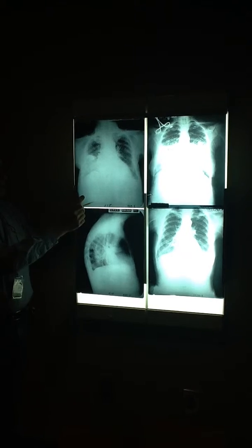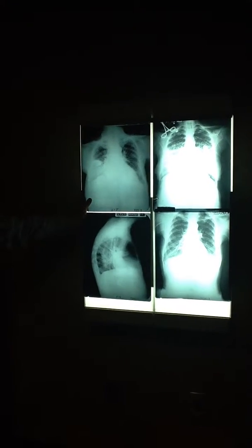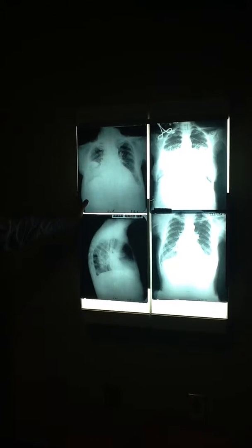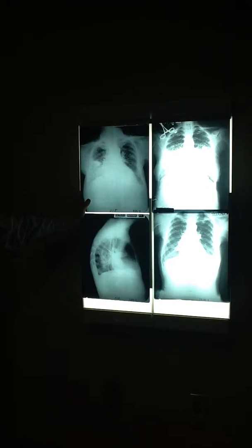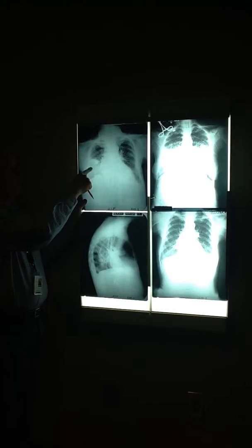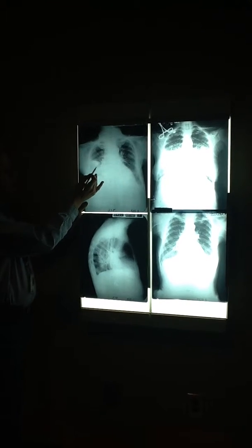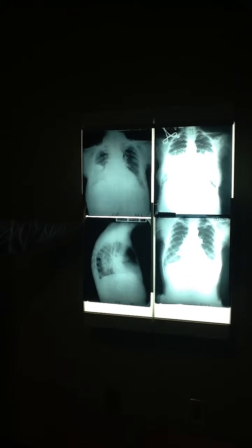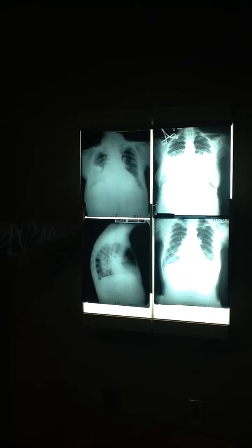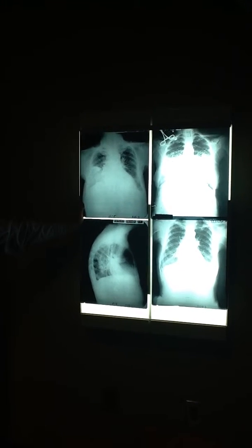So this patient needs to have their heart meds adjusted, and they're probably on a diuretic, but not enough. And so they need to increase the diuretic, get the heart pumping more efficiently. This will get reabsorbed, and it'll all disappear. It'll be gone. So this thing, which looks like a tumor, vanishes. So it's called the vanishing tumor, or the phantom tumor of congestive heart failure. It's an atypical pleural effusion. It's just an interfissure effusion is what it is.